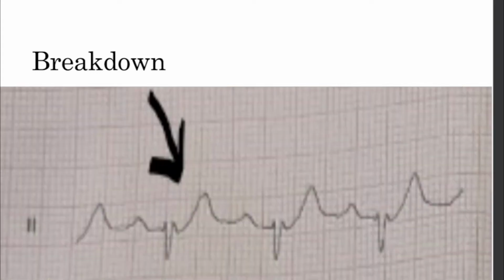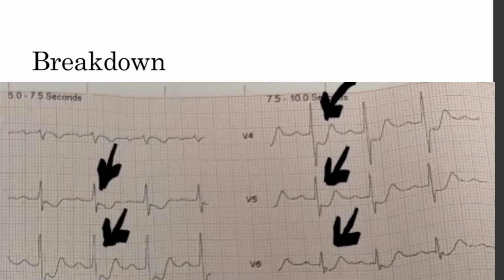If we scrutinize a little bit more of the 12 lead, such as precordial leads V1 through V6, we'll be able to see that there's a lot of ST depression. So V2 through V6, you're going to note a lot of ST depression. We note widespread depression in the precordial leads here. This is pretty interesting. There's no actual ST elevation anywhere on the first 12 lead that we're analyzing now. There is, like I said, notable ischemic ST depression in V2 through V6, and V1 looks slightly depressed as well, but we're not going to hamper on that too much.